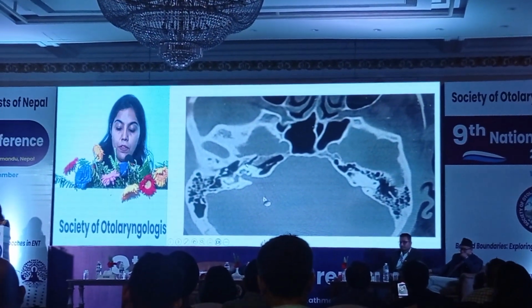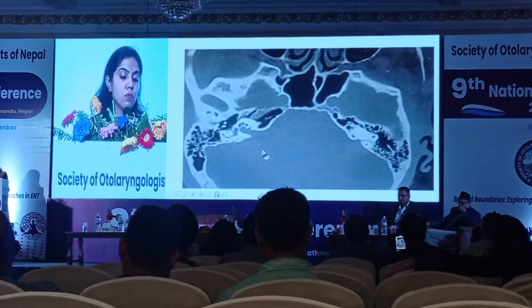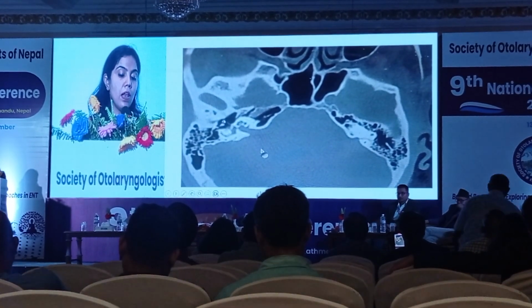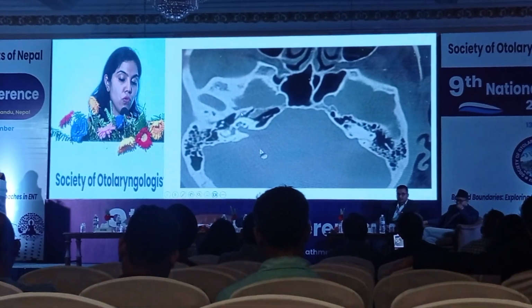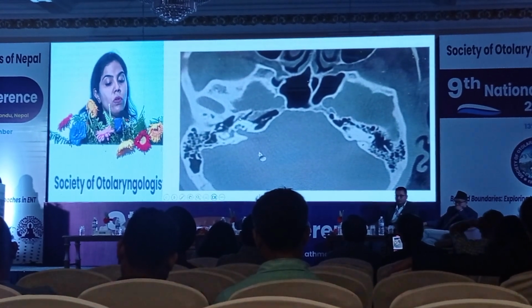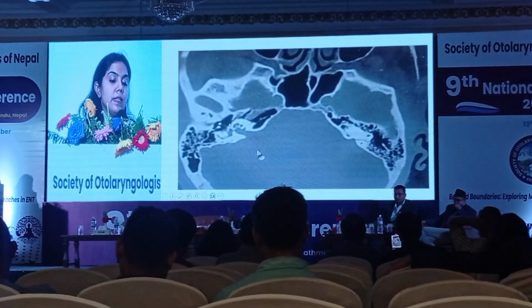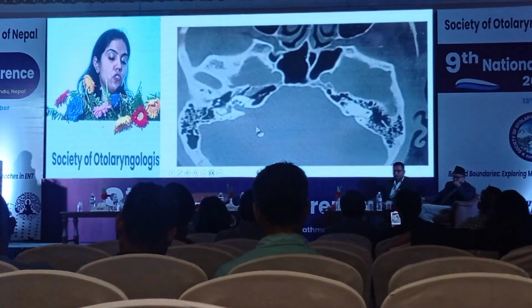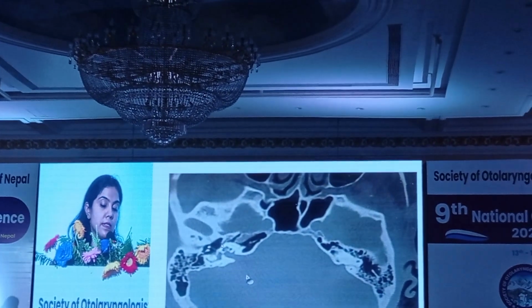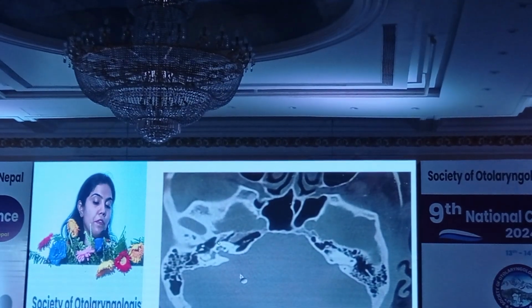As I go further, I see that the tympanic segment is not very clear though, but this was my broccoli appearance, this is my IAC, this is my signet ring lateral canal, and these are my ossicles, two dots. So this is the area of the facial nerve. Important to note, the tympanic segment of the facial nerve is beginning to come, and we see that the facial segment, the soft tissue density, is covered by a bony canal. So the facial nerve is nowhere above or lateral to the signet ring.